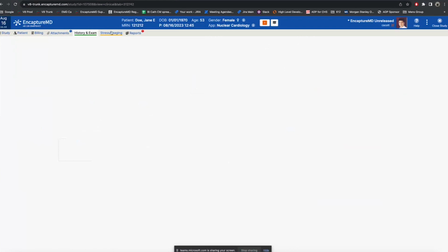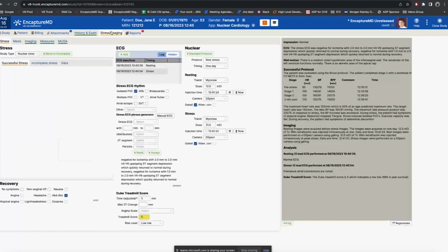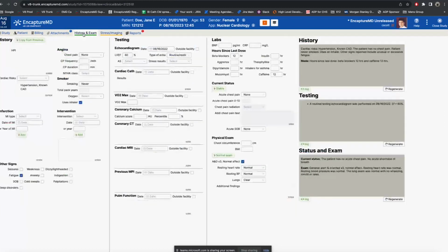And so now for nuclear, you do have the ability to do a brief H&P, and it can be as extensive or not. And there are different workflows here that are relevant. Some places will have an acute chest pain protocol, right? So somebody shows up in the emergency department with acute chest pain, they basically take them back to the scanner immediately, inject them with tracer, and image them. Because if they're actively having chest pain, they should have a defect. If they don't have a defect, then it's unlikely that this chest pain is coronary related. So there are places that do acute chest pain protocols.